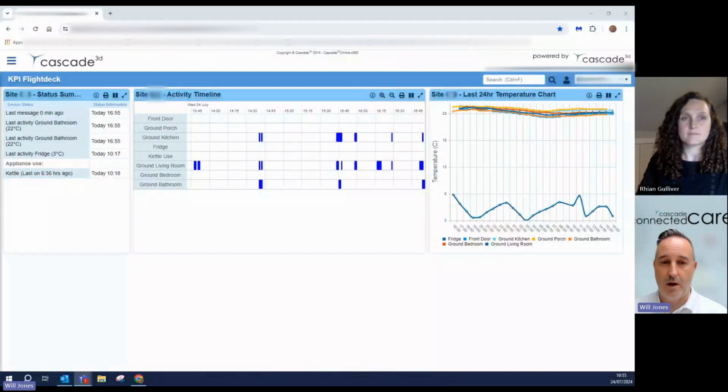I'm here today just to give you a very quick overview of our connected care system using our desktop version on your computer. By now, the installation team should have sent you your username and login. Have you got both of those? Yes, I do. Okay, so I've already logged in to the system that's in your mother's house. You just have to put the username and login into the website, and then you should see something like this screen that appears when you log in.